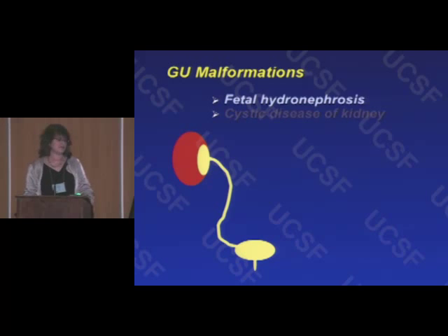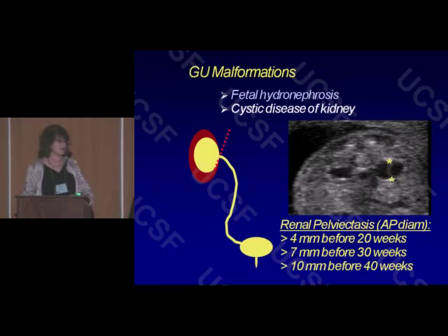As for hydronephrosis, it's worth remembering that, like in postnatal life, the level of obstruction can be at the UPJ, at the UVJ, or bladder outlet. The associated sonographic findings and the differential would be informed by that observation. So starting with dilatation of the renal pelvis, but of nothing else. First, the definition.